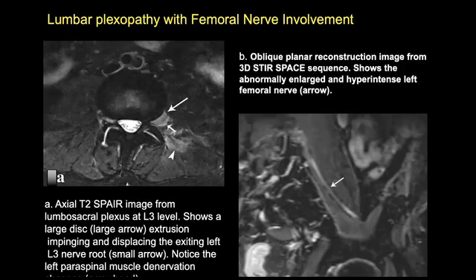of hyperintense L3 nerve. Some people use the term radiculitis. I'm not sure that that's the most appropriate term. We tend to shy away from it because it's not really inflammation in the nerve. So we're kind of stuck with L3 nerve that's showing abnormal signal, STIR hyperintensity, often may be swollen or enlarged compared to the contralateral side.